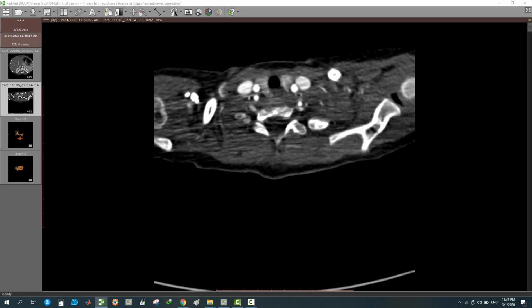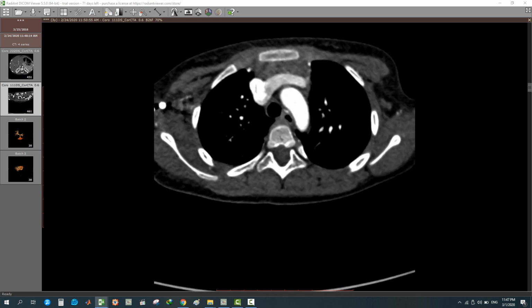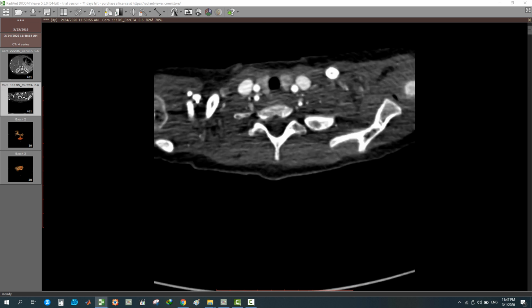First of all, the first image is a known case of tetralogy of Fallot for multi-slice CT or cardiac CT to assess other muscular or additional VSDs, major aortopulmonary collaterals, coronary anatomy, and central and peripheral pulmonary artery anatomy. This is the role of CT in tetralogy of Fallot. First of all, we will begin with the best diastolic phase.